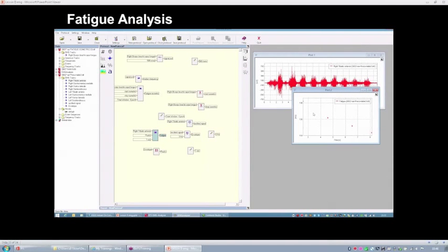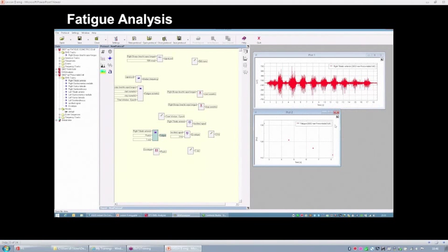As you can see, also in this case, we can see a decrease of the median frequency during the different contractions of the muscle. So this is another example about how to use the frequency analysis of an EMG signal to investigate muscle fatigue. Okay, so, well, I think that we can stop this lesson.